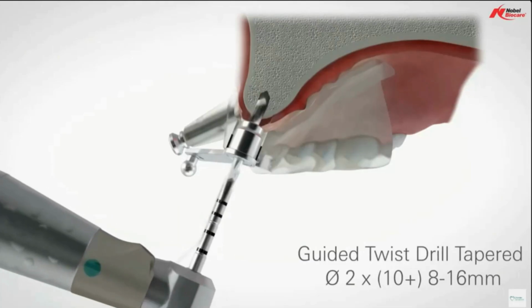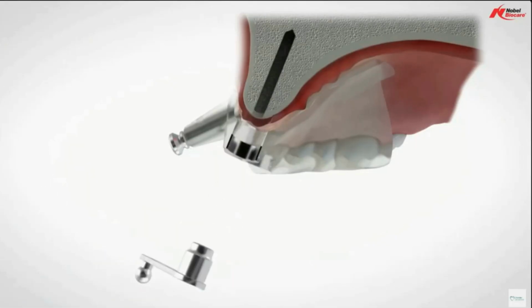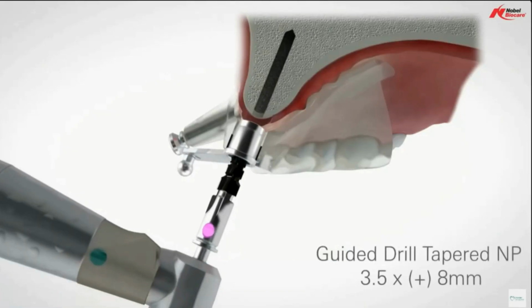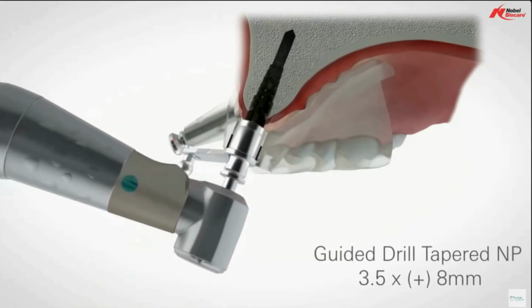Remember, I mentioned that the top of the guide sleeve is 10 millimeters from where the implant head is. So the intention, and I joked about the hockey stick, is that there are 2 points of contact. If you just had this at bone level, you would have no way of predicting the trajectory of your drill.